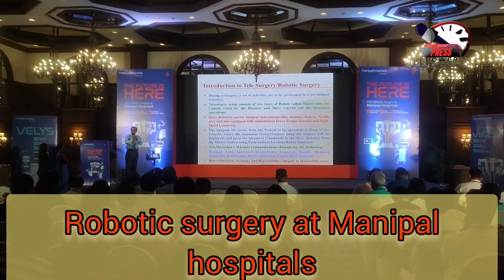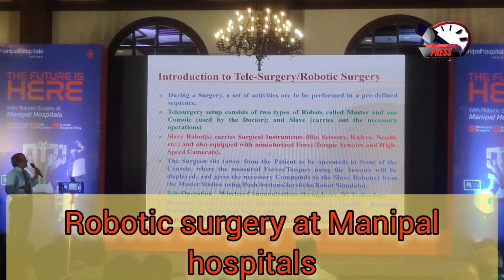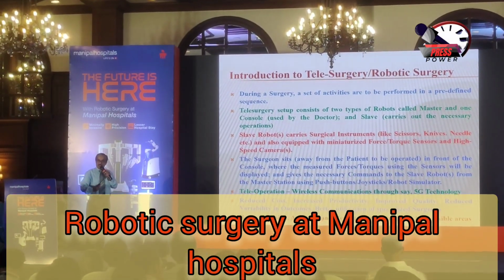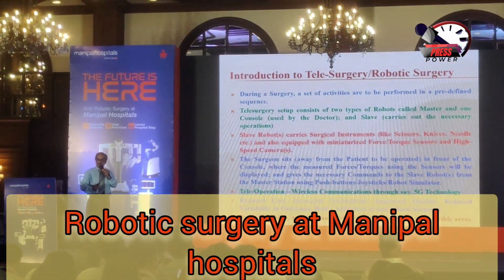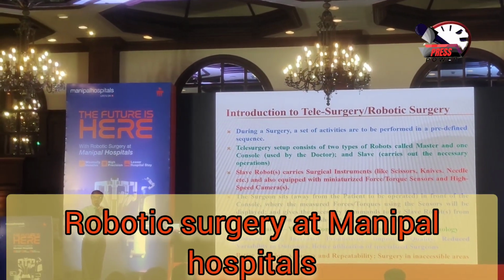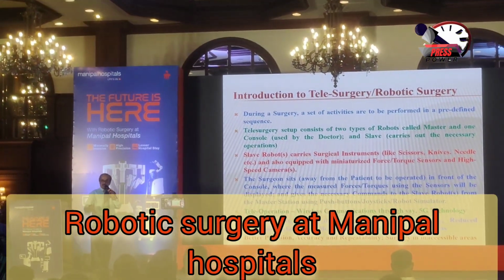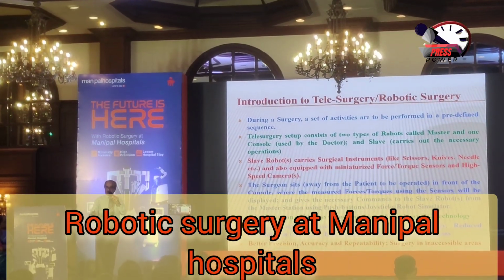Another is the slave. And this master robot has one console also. So the doctor is going to sit with the master robot and the console, and the actual operation will be carried out by the slave robot. And this particular slave robot is going to carry all the instruments which are required for carrying out the operations. For example, scissors, knives, needle, those things will be carried by the slave robot.